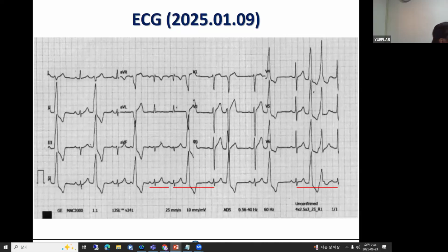That's another thing. The second thing is aVL is a QS completely, and then lead I is dominantly an S wave. So this is most likely a septal focus. You cannot exclude the possibility of the left side. Therefore, in the practical sense, before you ablate, you're going to map both sides. That is the answer we're trying to get to.